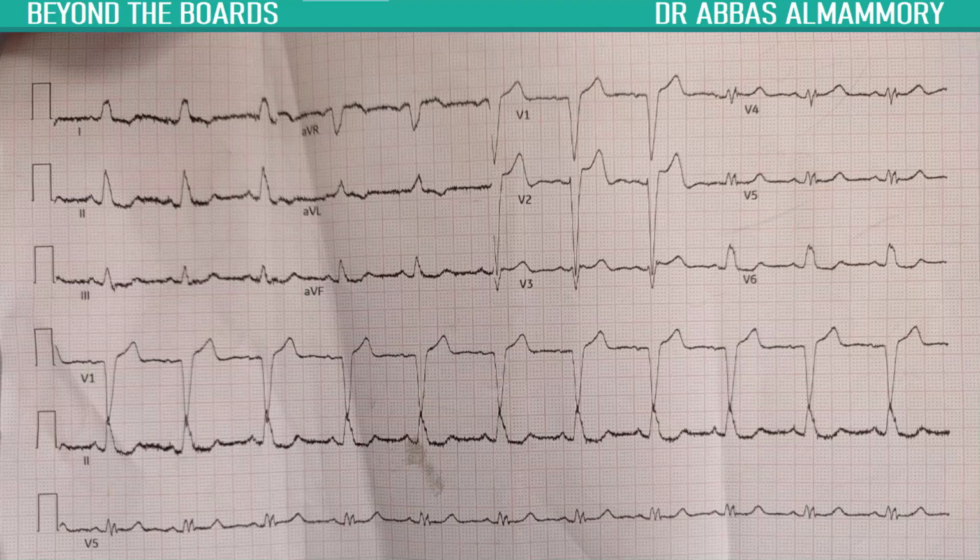good because concordant changes, so when they face in the same direction as the QRS complexes, are considered abnormal, and they may represent ischemic changes, especially if a patient presents with chest pain. And also, they're considered abnormal if the ST elevations are too excessive. And the way you can gauge that is that if it's more than 25% of the preceding S wave, that is at least according to the Smith criteria, or more than 5 millimeters according to the Sgarbossa criteria.